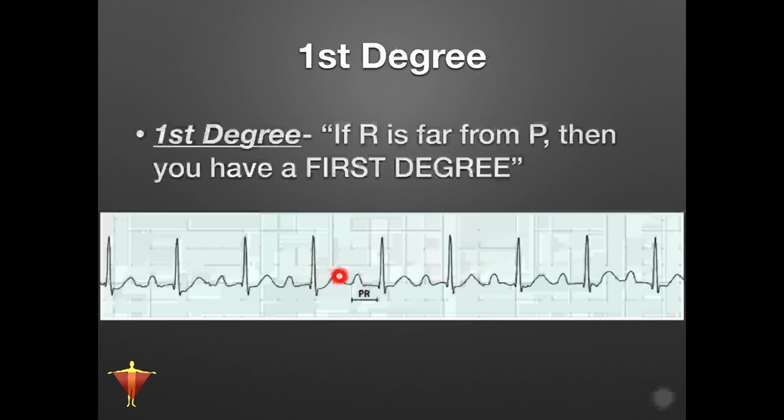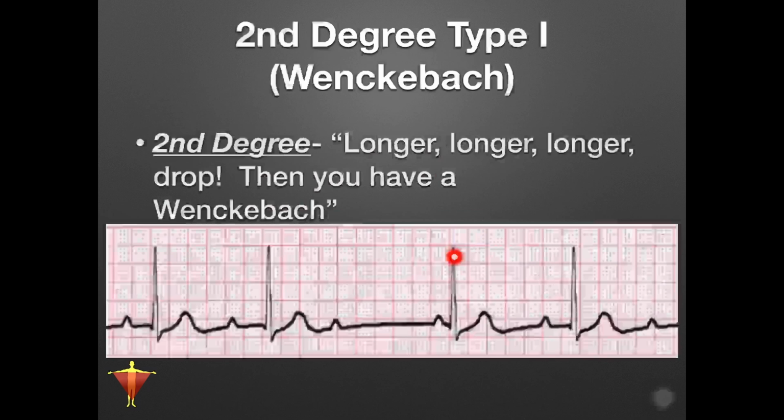So it got longer, longer, until it dropped, and then the heart had to reset somewhere in here to send that P wave, right? The SA node had to fire off to get the heart reset again. But as we can see here, that PR interval seems to lengthen again, which it probably just follows this rhythm of dropping a beat somewhere after that.